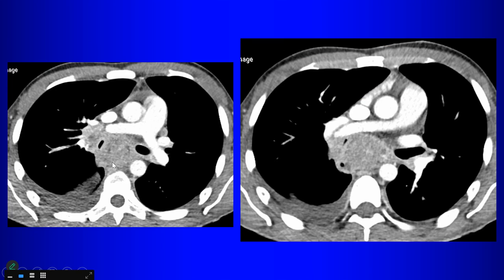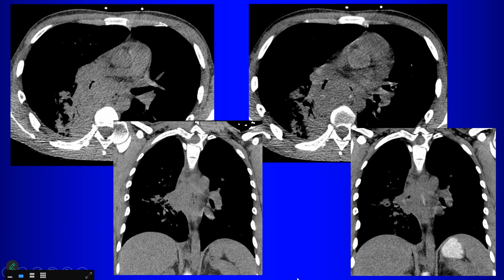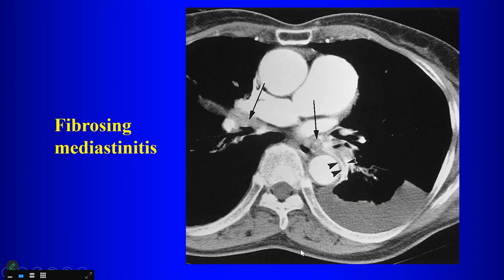So there's this mediastinal lymphadenopathy here, right, within the mediastinum. And this patient, it's quite subtle. This is actually after we gave the patient oral contrast to drink. And you can see there's just this tiny bit of oral contrast that's here outside of the esophagus, and it's gotten into the mediastinum. So that's because of fistulas that can form from the esophagus to these mediastinal nodes.